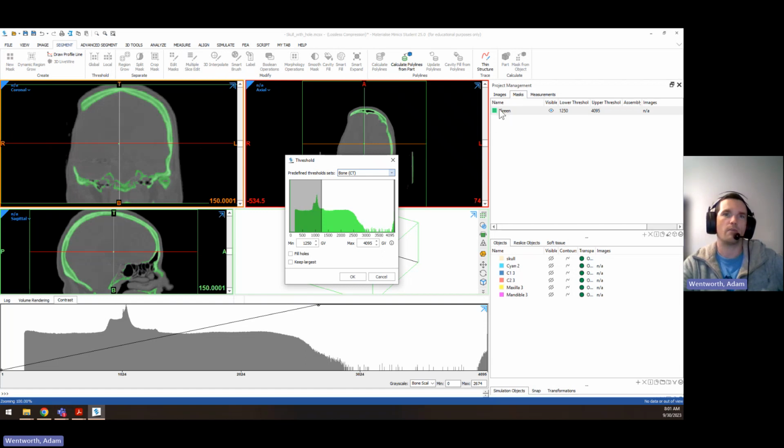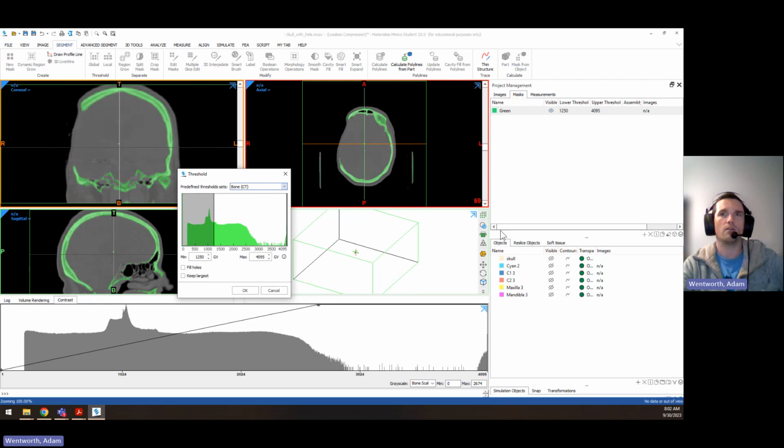Segmentation is really about separating volumes of anatomy by marking pixels on 2D images, and then doing that for all the images, such that we can make a volumetric object from voxels, or three-dimensional pixels. Each of these pixels is extruded into the thickness of the CT slice, which you can see as I scroll my mouse through the slices. Between each slice, those pixels are interpolated or extruded. And if I click this little icon over here, I can get a 3D preview of what has been selected from this threshold.